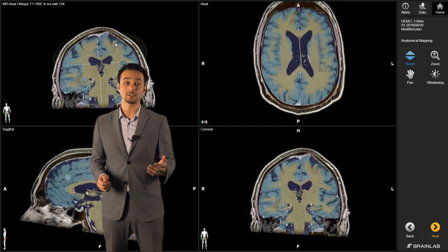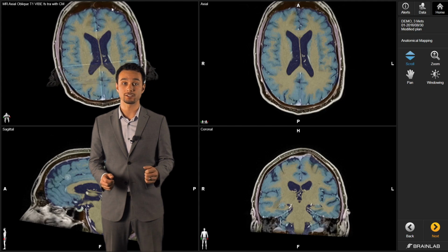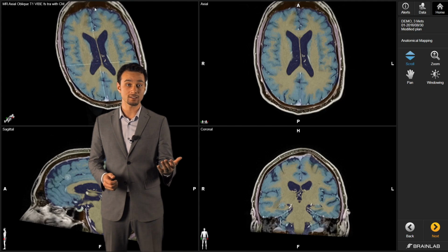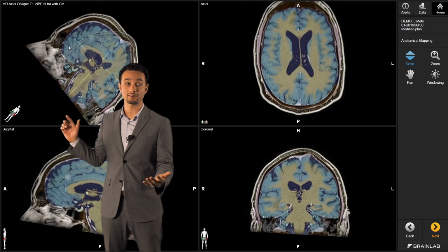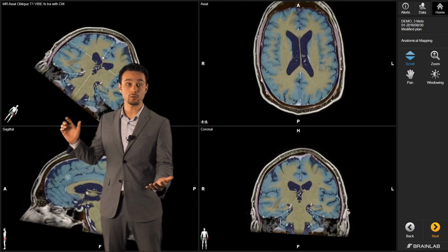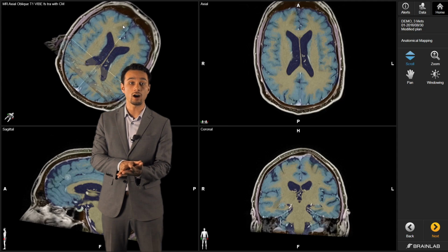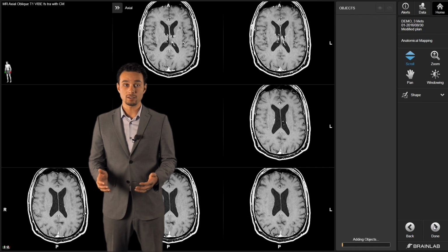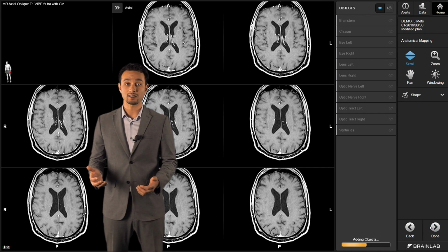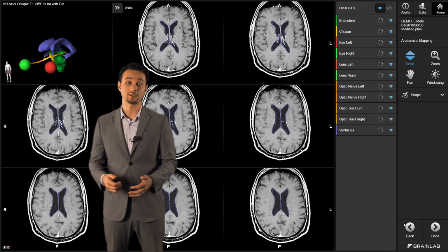What you see here is the actual tissue classification that happens on your particular dataset. Here, this is a T1 dataset. So the next step, we're going to use the 3D model that we have, create a T1 dataset with all the tissues classified, and elastically morph that model onto your patient dataset. When we click on Next, you can see the default structures are automatically created. These structures are specified based on a template that you can modify.